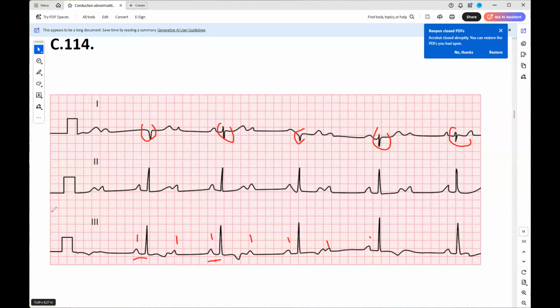Okay, but for sure it's very difficult to determine what the axis could be. And as you see here, 2 and 3 are not the same. 3 is a little bit bigger, so you are right, a little bit more than 90 for sure. But we don't know whether this is 100 or over 100. Okay, good. All right, next one.